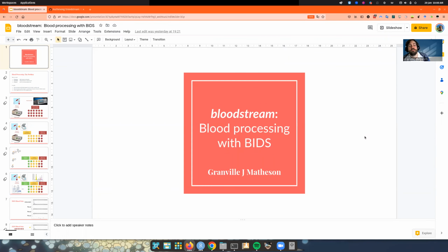Welcome. My name is Granville Matheson, and I'm going to talk you through how to use my BIDS tool called Bloodstream. Bloodstream is aimed at doing blood processing with BIDS data, BIDS PET data at least, where there is blood data available. The idea is that it makes it a little bit easier for everyone to do blood processing so that you're ready for kinetic modeling using the processed blood data.